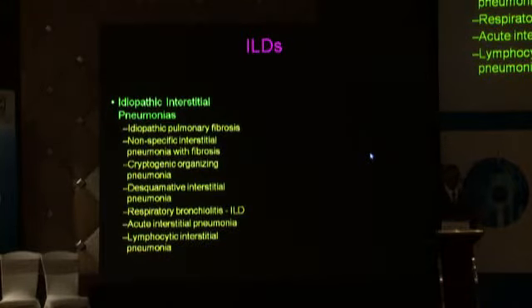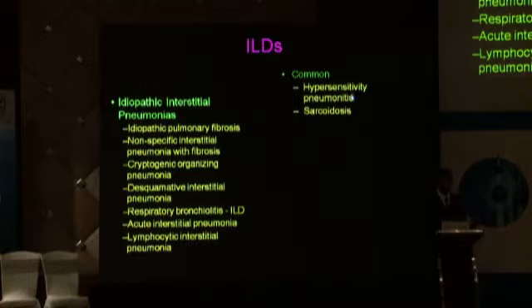So what we've done in the last about 35 to 40 odd minutes is we've looked at all these 7 idiopathic interstitial pneumonias. We've looked at honeycombing equals the UIP pattern equals IPF in the absence of an etiology, NSIPs that typically occur with connective tissue disease, organizing pneumonias that present with fever, Velcro rales, and a combination of consolidation and ground glass attenuation, DIP and RBILD that pretty much occur only in smokers. AIP is acute, and LIP occurs with Sjogren's and in patients who are retroviral positive.